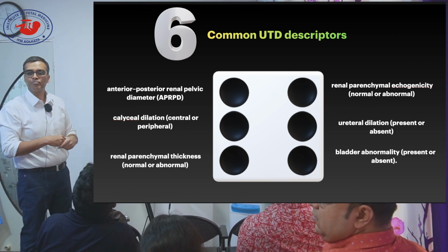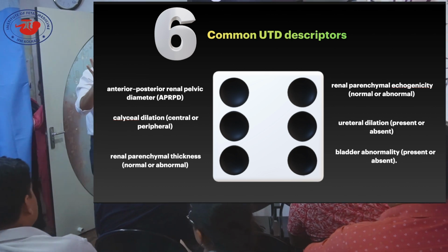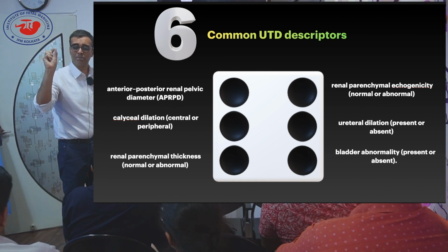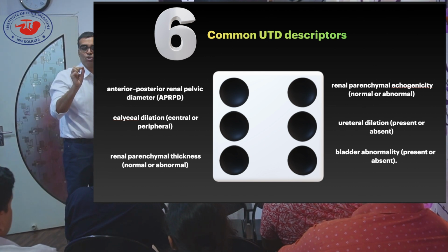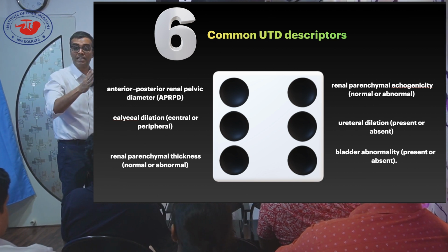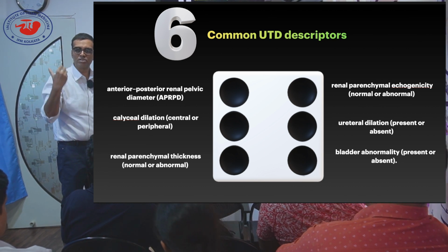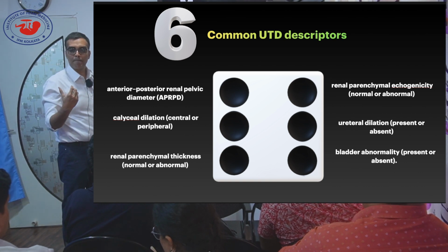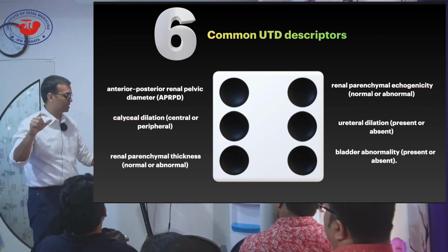Parenchymal thickness and echogenicity means abnormal types I'm asking. Yes. What are the abnormal things we see in that? And apart from cystic things and those? Yes, apart from the cystic things, if it is too much of dilatation, there will be thinning of the parenchyma. But in antenatal life, there is no particular threshold, like postnatal, where we have 3 millimeter. There is no threshold that I say, okay, this is thin, but it is subjective. If there is too much dilatation of the collecting system, we know the parenchyma looks thinned out. When age increases, the pyramids become more prominent. Yes. But that is if it is less echogenic, that is a normal part of the syllabus. Yes. I will show you with case examples. Okay, that will answer your doubts.